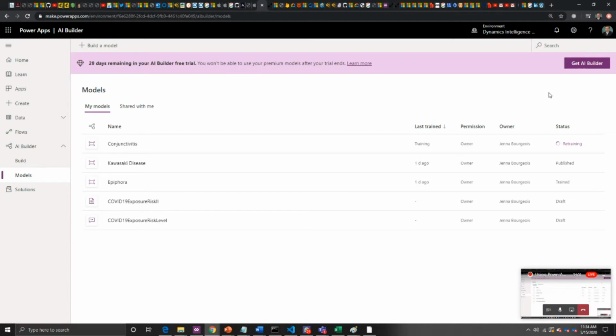It could be the size of the box that I selected around the eye. It could be the image itself. Out of that 25, you might have to go through several iterations where you try removing certain images and changing the size of those boxes to really test for what you're looking for.